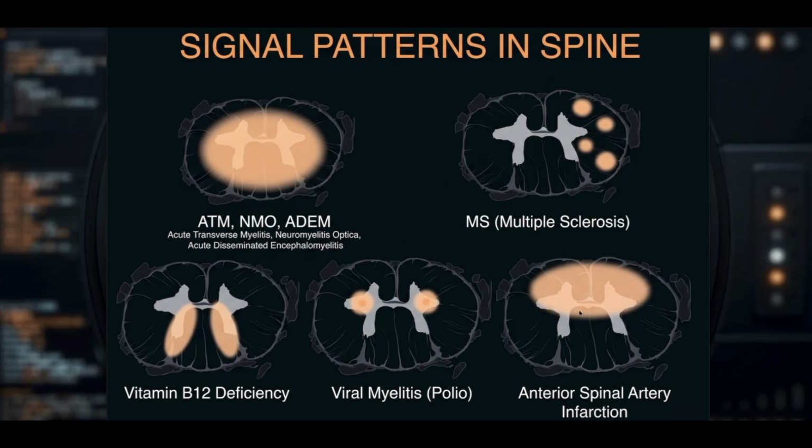If it's acute, you see the edema. If it is old, we see gliosis and atrophy, but it is located anteriorly. Sometimes it's like bifocal, it is sparing the posterior parts because it has a different blood supply.